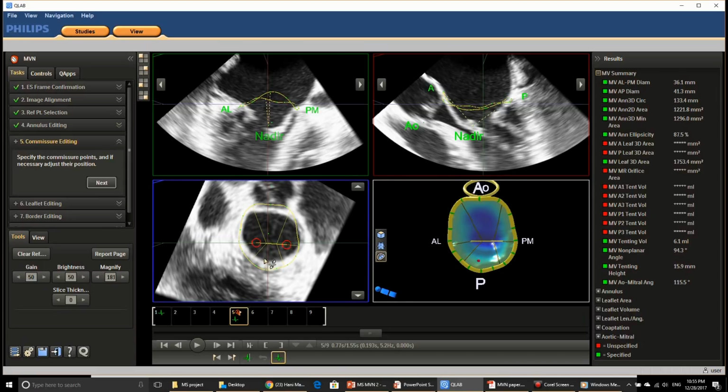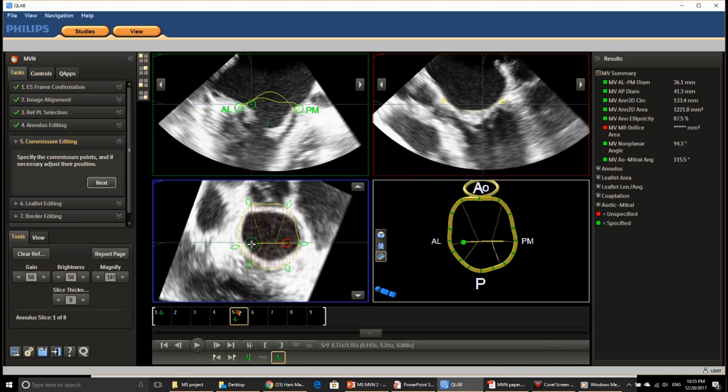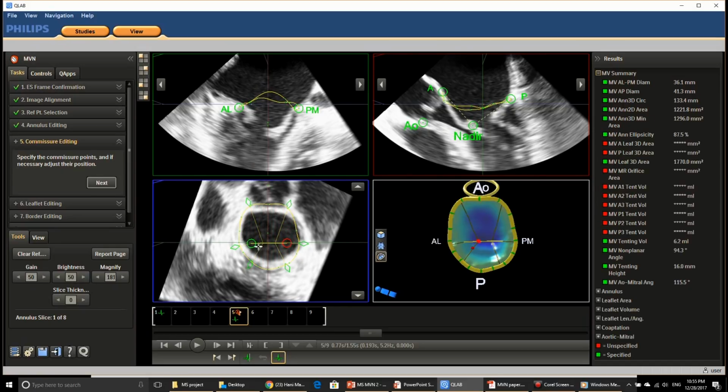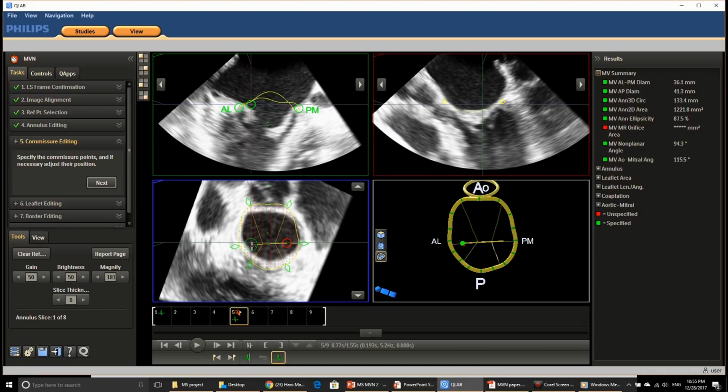And now, please focus with me, because once you click on this, you can see here, this is the long axis view of the mitral valve at the level of the red frame. This is the red frame here. Okay, so this is the long axis at this level. Once I click here, you'll see a lot of red frames or red lines inside the mitral valve annulus here. And once I move my green circle, the image here will change accordingly, because it will give me the long axis view along each line I'm on. So this is the long axis.